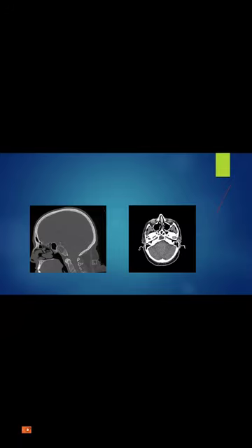But if you see an expansile lesion in the clivus, cortex is fine, central hyperdensity or central cystic-like lesion, most of the time this is fibrous dysplasia. Fibrous dysplasia everywhere else has a ground glass matrix, but here in the clivus, it characteristically has this appearance.